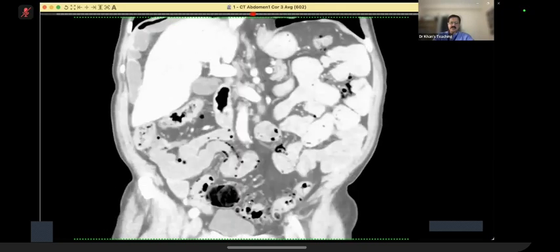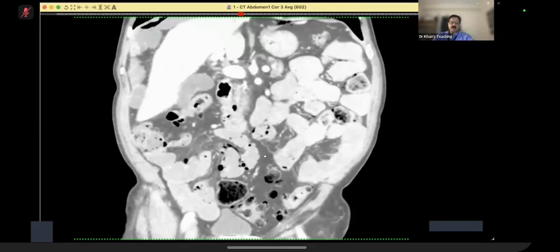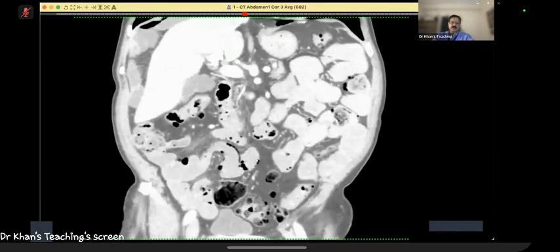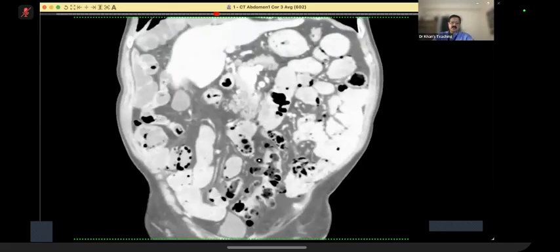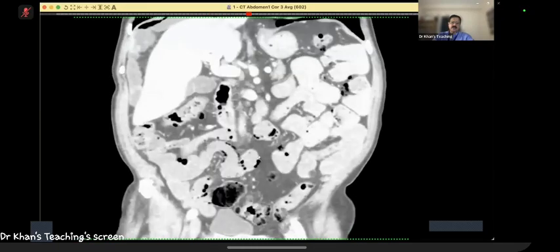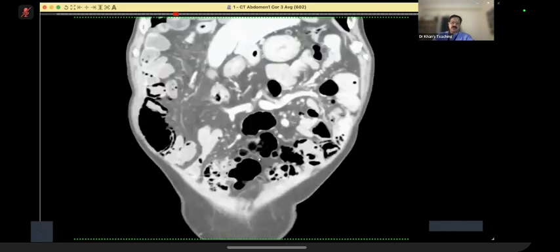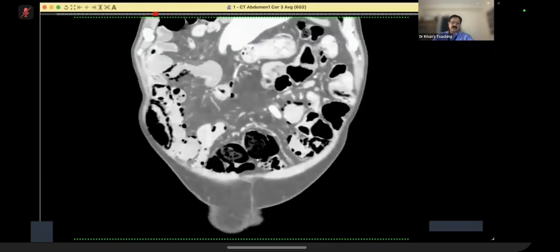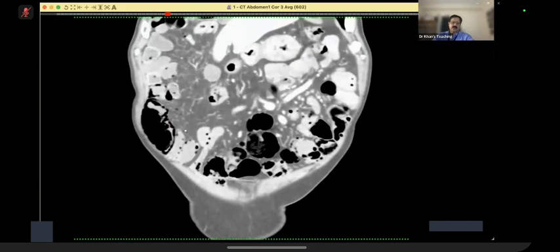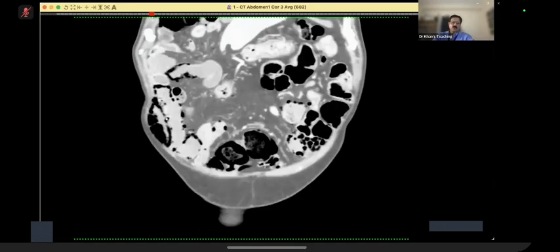And then you did pick up some of them. For example, I think this is one you picked up on axial, but everything else, you can convince yourself going up and down that these are in the wall, changing windows and things like that. So it's a good case where the findings are very, very emphatic. Look here, all of this. And the barium which I showed you, remember how it was.